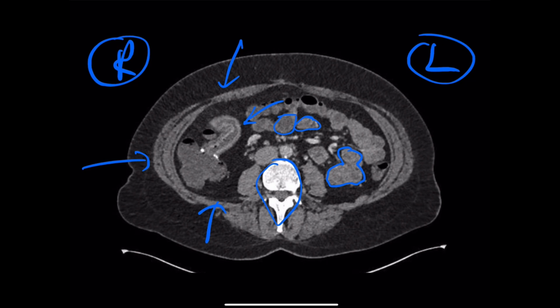Well, in this particular case, we're actually not seeing narrowing. We can see a lumen down the middle, so it actually isn't properly narrowed on this particular image. But what we can see is that there is some mucosal enhancement. That's one of the radiological things we look out for to see if there is active disease. So is that really pointing towards a re-emergence of Crohn's in that area?